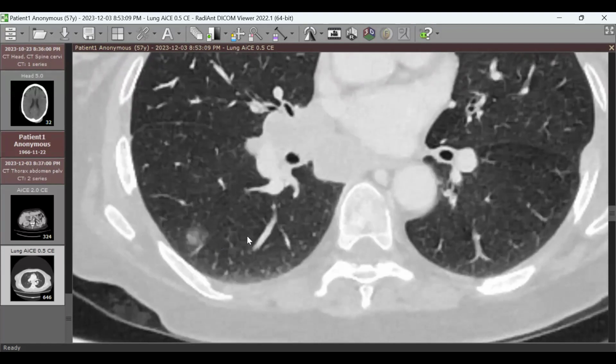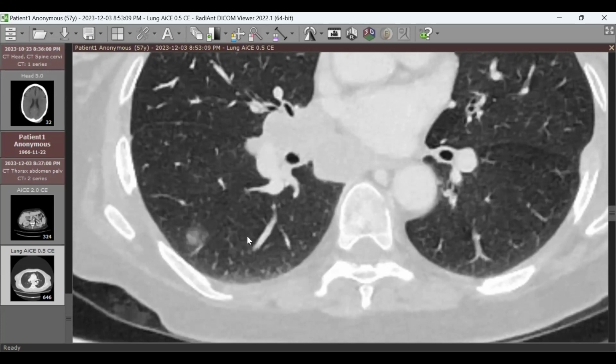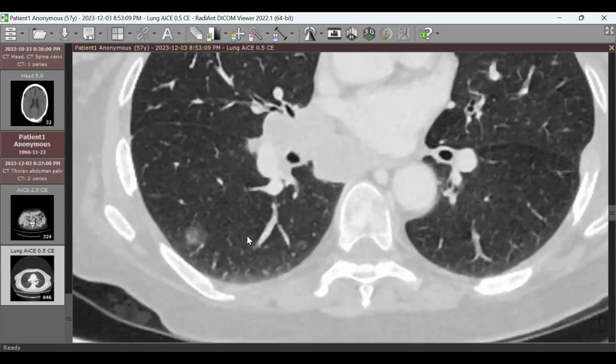My point is that if it is totally ground glass, it's a different thing than if it is ground glass plus the development of solid elements within the lesion. This is very important. Why? Because this could be a part of the spectrum of adenocarcinoma. So if you have a stable ground glass lesion less than 5 millimeters, that could be atypical hyperplasia. If it is between 5 and 30, it could be adenocarcinoma in situ.